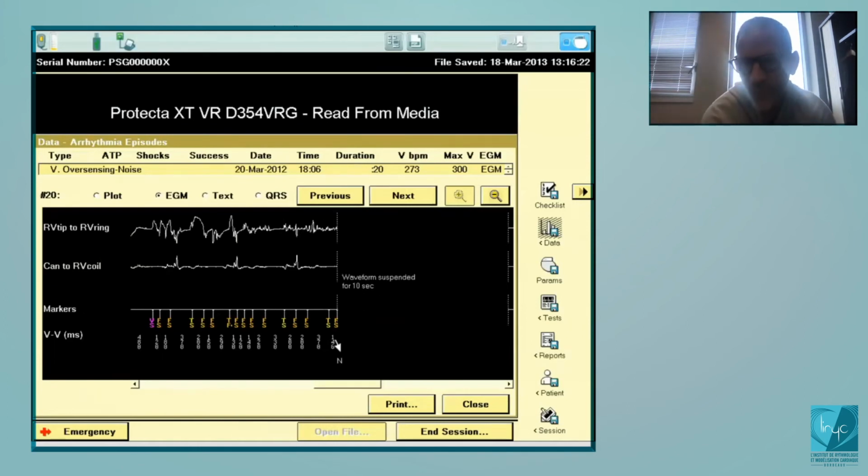Once more, to write this and to collect these cases, I have tried to find cases of T-wave oversensing. In all the patients with T-wave oversensing, the algorithm worked pretty well. In this case, it was not so obvious. I have seen not many, but some cases at least of first diagnosis with the noise, and then at one time the therapy is delivered because no diagnosis anymore of noise or sensing.